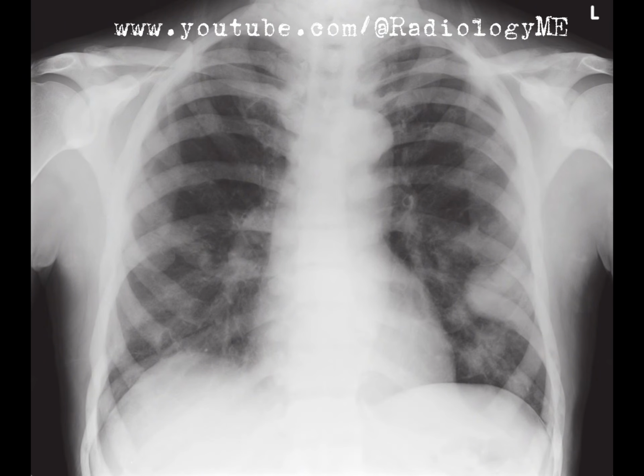They might also ask, how would you distinguish between these causes on imaging? For metastatic prostate or breast cancer, you'd look for bone scans showing osteoblastic activity and possibly other signs of the primary malignancy, like lytic or sclerotic lesions. For renal osteodystrophy, you'd want to correlate with clinical signs of renal failure, soft tissue calcifications, or the presence of a dialysis catheter. For rarer causes like osteopetrosis, you'd expect a more homogeneous pattern of bone sclerosis.